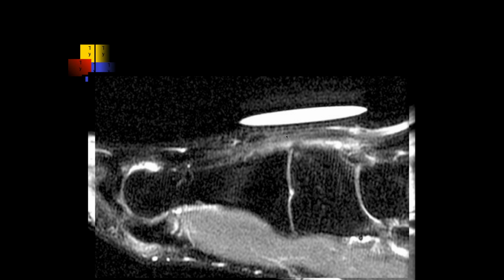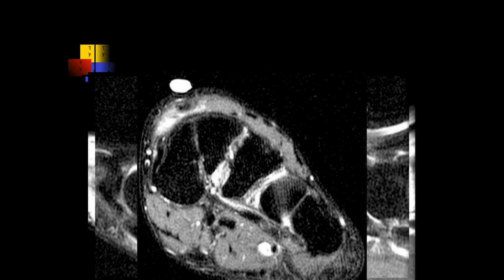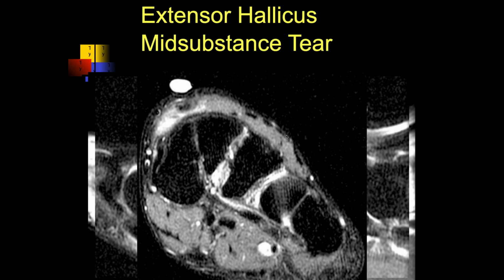A little bit of motion artifact, but I think there's a distal tear here of the extensor hallucis longus tendon. We can see a lot of edema here. Yeah, so this is kind of a distal mid-substance tear of the extensor hallucis longus. Good.